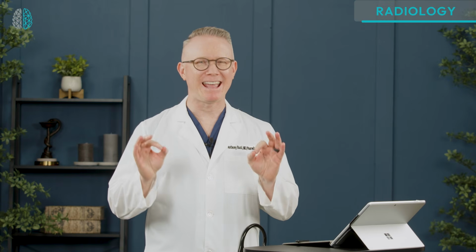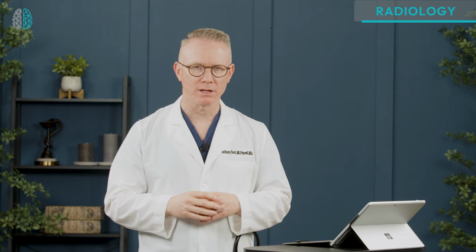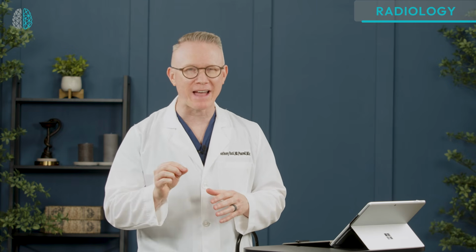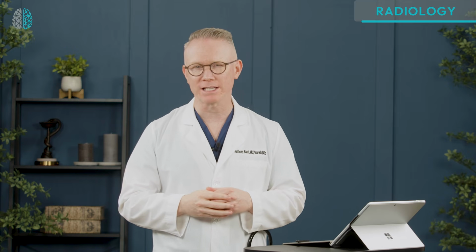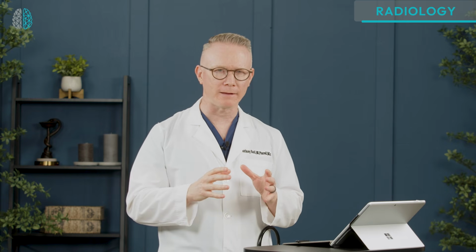Before you interpret any chest x-ray, ask this: can I even trust the image? In this video, how to check patient positioning on a chest x-ray, I'll show you a fast and easy way to determine the chest x-ray positioning so that your chest x-ray decisions are based on good x-ray image quality.